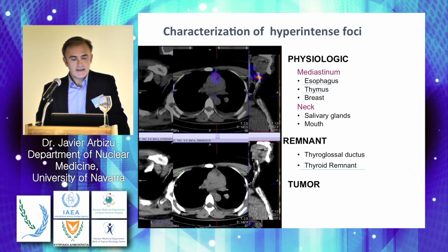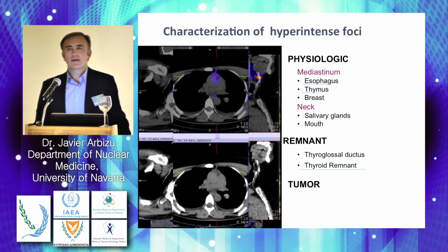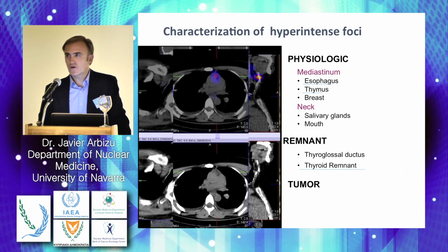We can see here the esophagus very clearly with some hotspots that could in some way be misunderstood as some focus of mediastinal lymph nodes.